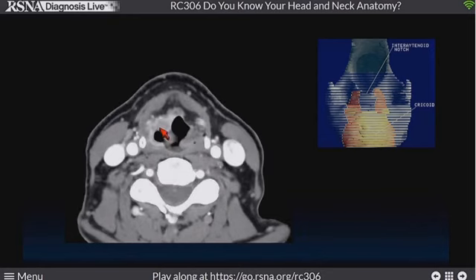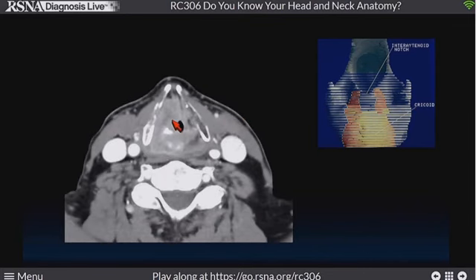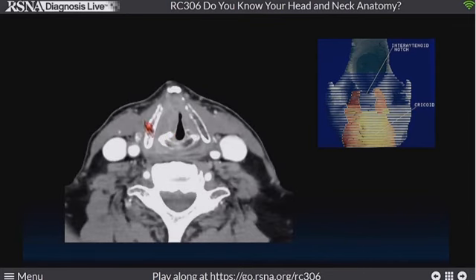And so here you see the tumor. Here is an old 3D image. Here's the piriform sinus. Here's the arytenoid, corniculate. Here is the cricoarytenoid joint. And if you go through that mucosa, you end up in the paraglottic space. And it infiltrates. This one went all the way down to the cord. Because of that, we actually describe lesions that are in the lower pharynx and piriform sinus.